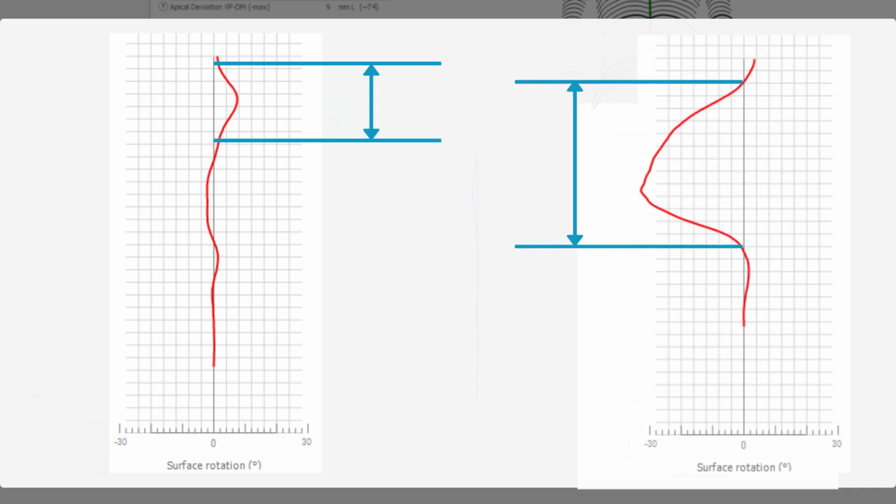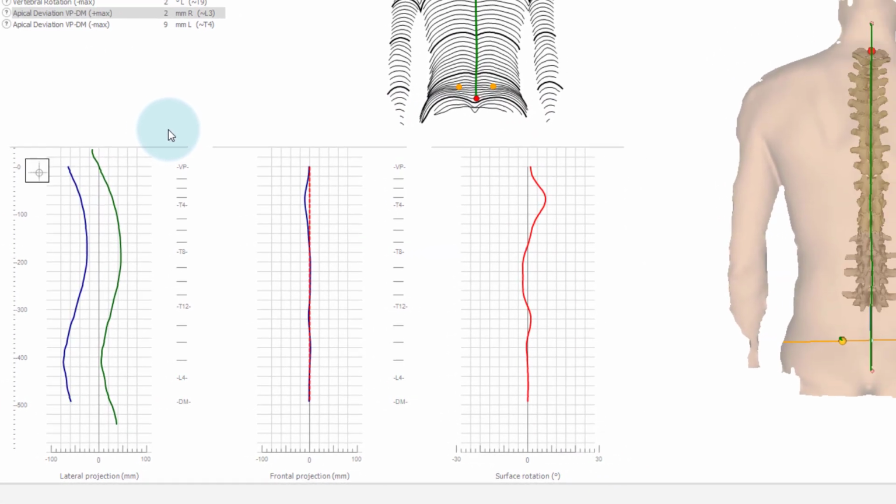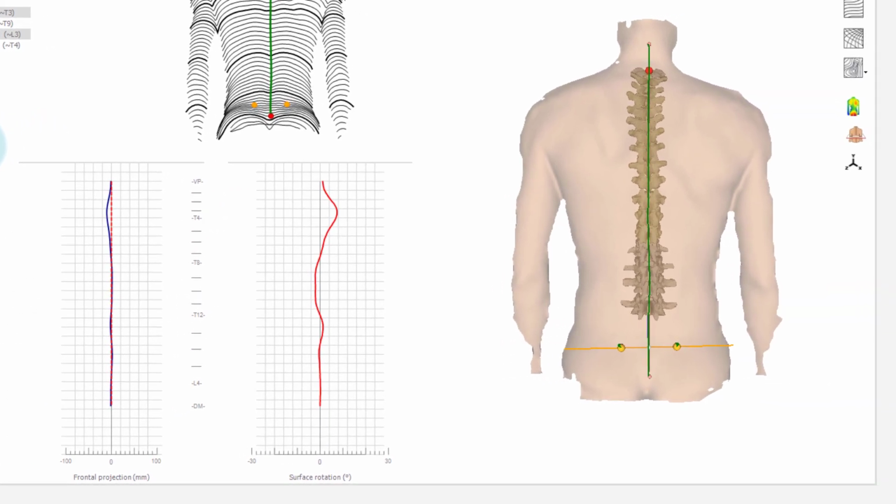Long arch rotational trajectories are usually the result of a longer history of compensation and dysfunction. A short arc is commonly related to a short-term reaction that has turned into an adaptation and realignment that is able to meet everyday mechanical and functional demands with reduced energetic expenditure. A special feature becomes clear in this graph. The lower end always runs to zero.